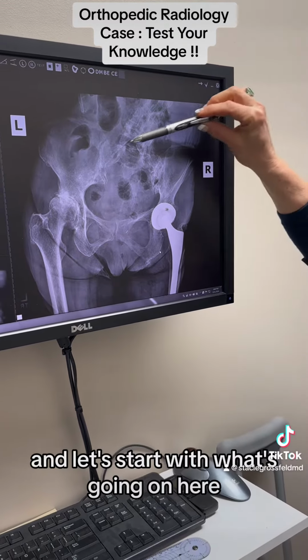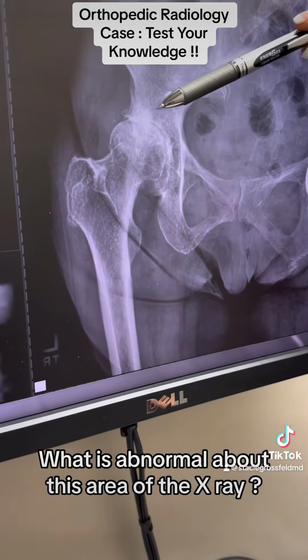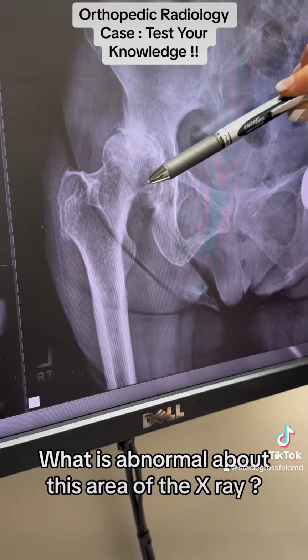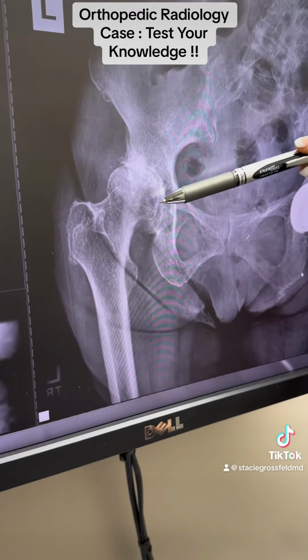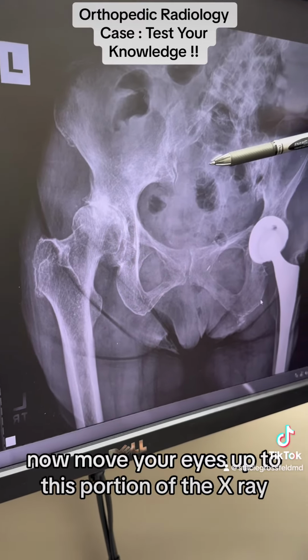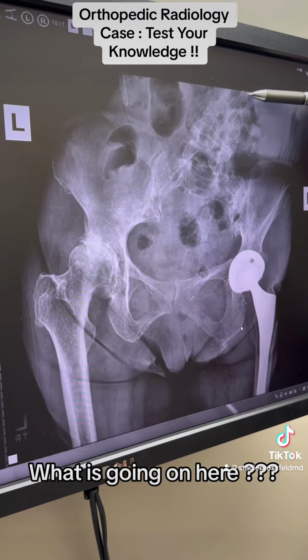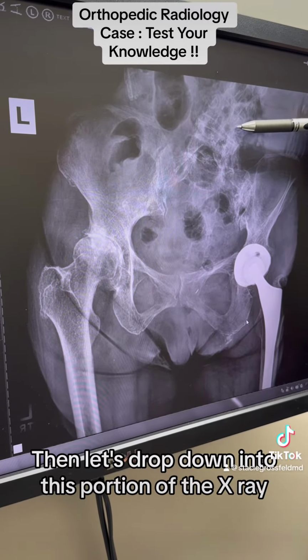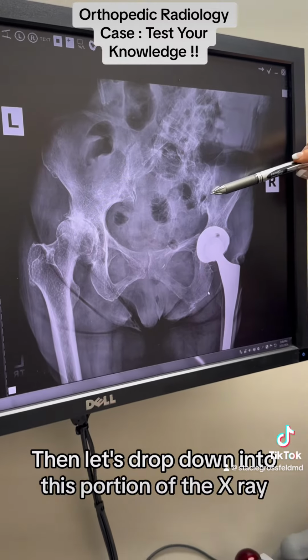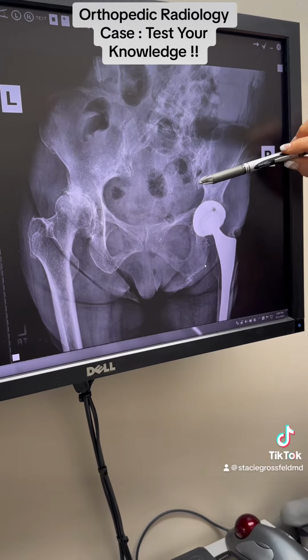Let's start with what's going on here. What is abnormal about this area of the x-ray? So that's number one. Now move your eyes up to this portion of the x-ray. What is going on here? That's number two. Then let's drop down into this portion of the x-ray. What do you see here?